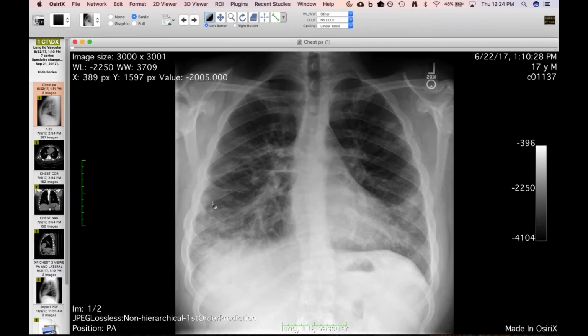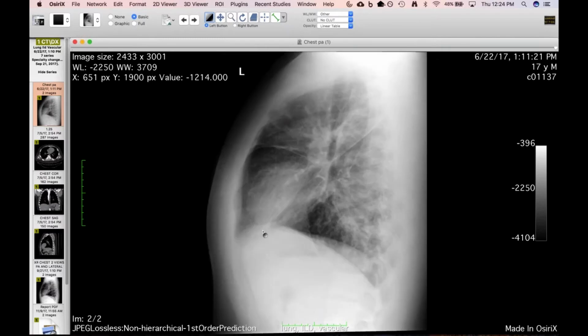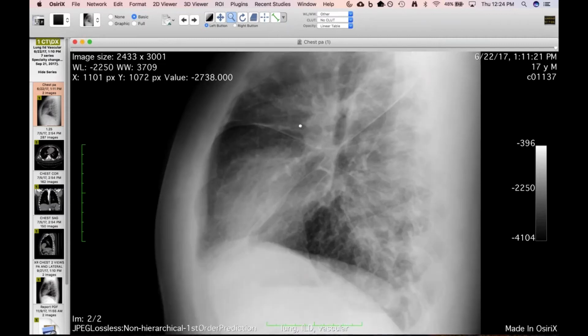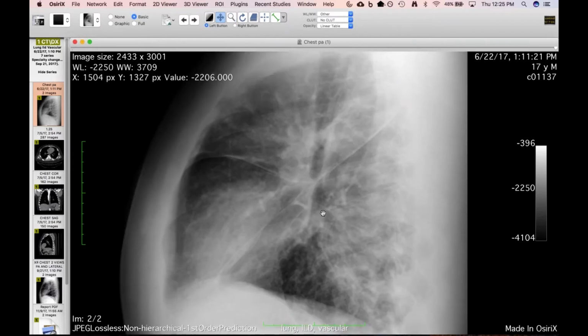The first thing I thought when I saw this radiograph is he's got bilateral, somewhat peripheral and symmetric areas of consolidation. Given his protracted course, I was thinking originally that this is maybe going to be organizing pneumonia based on this look. What's interesting on the lateral view, and I know Howard likes to talk about this a lot, is just how thick the fissures are. It looks like subpleural edema on this radiograph.